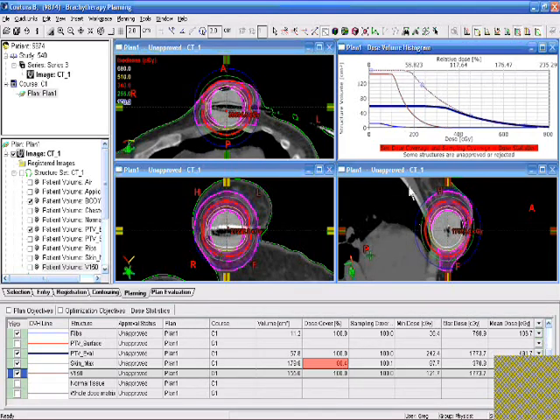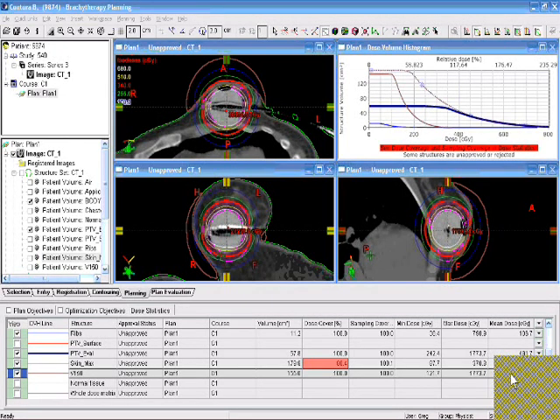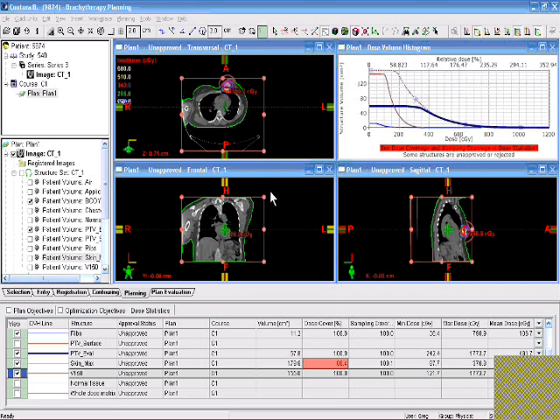Now, in this particular case, we get a warning in the DVH because the default calculation matrix won't cover our skin max. Let me show you the skin max. Here's skin max, and generally what they will do is they'll create a default box around the body contour. So we won't be calculating all of that volume effectively. So we're going to have to fix that before we go any further. And I'm going to go back and do that offline so that you don't have to sit here and wait for it to happen. I have reset to standard views here so that you can see that.